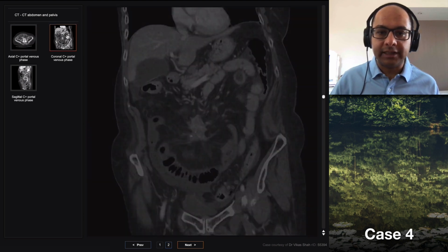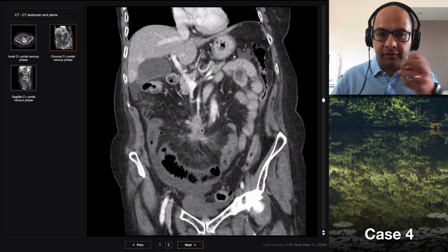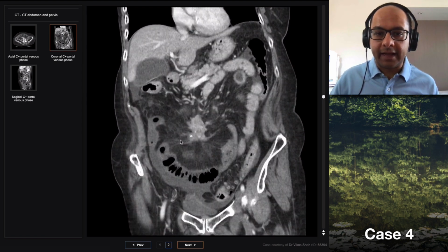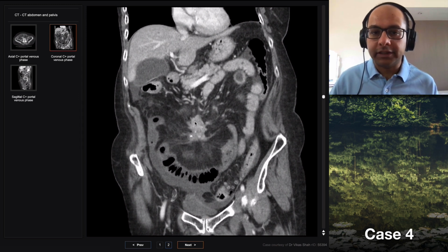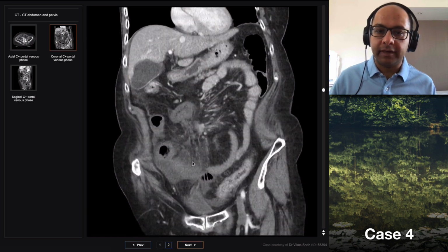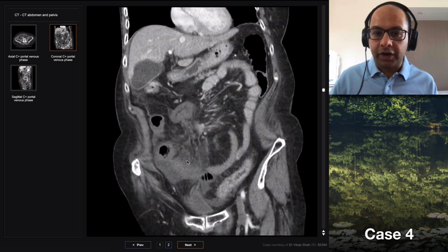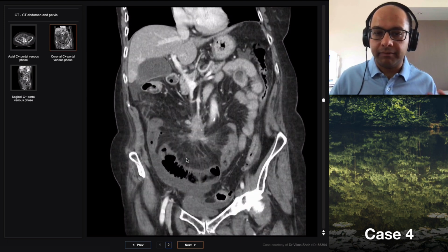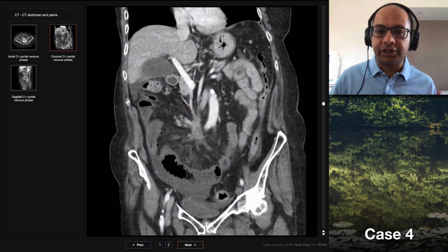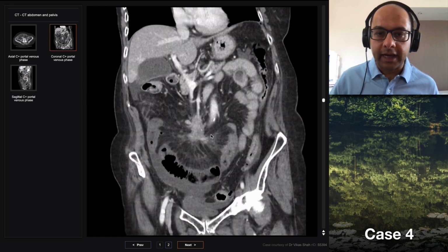So this is absolutely typical for a mesenteric carcinoid tumor. This is what it does. It wraps the vessels into it, and then there's this combined arterial and venous ischemia of the associated small bowel. So whatever length of small bowel is being supplied by that portion of the mesentery will undergo this process of chronic arterial and mixed venous ischemia, and then eventually will reach a trigger point which makes this patient attend hospital. And look for those little foci of calcification, this irregularity.